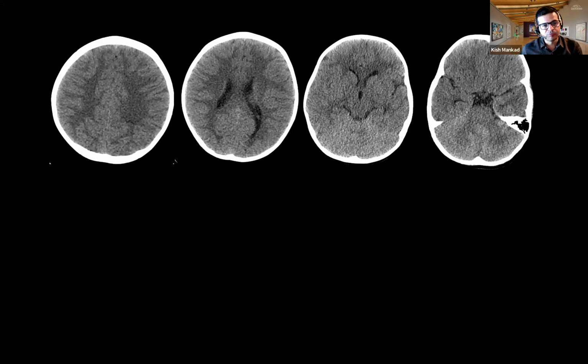This is a child who's 4 years of age with headaches. We've done a CT scan, and we do a CT scan because it's easily available, but we run the risk of missing findings, and it was missed in 2 hospitals. I'm showing you very select images here to get your eye into it. And this is a PowerPoint platform today because these are historic cases. In fact, they don't even exist on our hospital archives anymore, but seriously, seriously important cases.